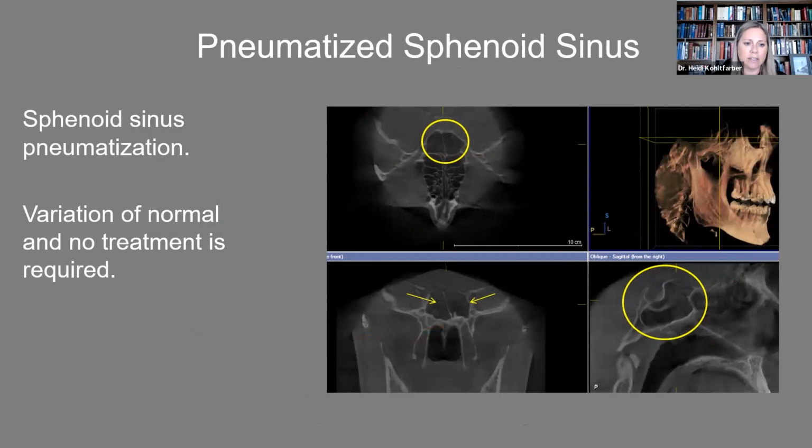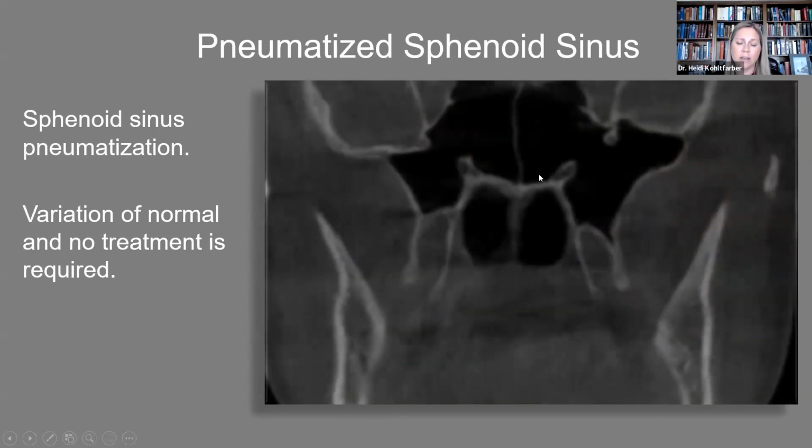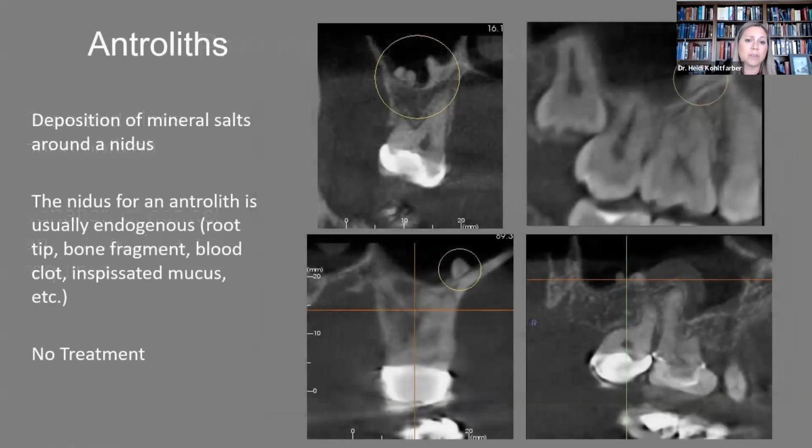Pneumatized sphenoid sinuses, that's very, very common to see pneumatization of the sphenoid sinus. Sometimes people get concerned about that, but that is very common. They can fill up the entire sphenoid bone. That is nothing to worry about. That's what they should do.